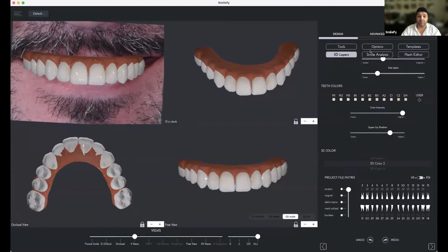And I have now an idea. I can take this design, export the design the way it is into my implant software. Based on the design calibrated with the intraoral scan, I can plan my implants, I can plan my surgery. I know the design is here, and that's going to be the design, right?